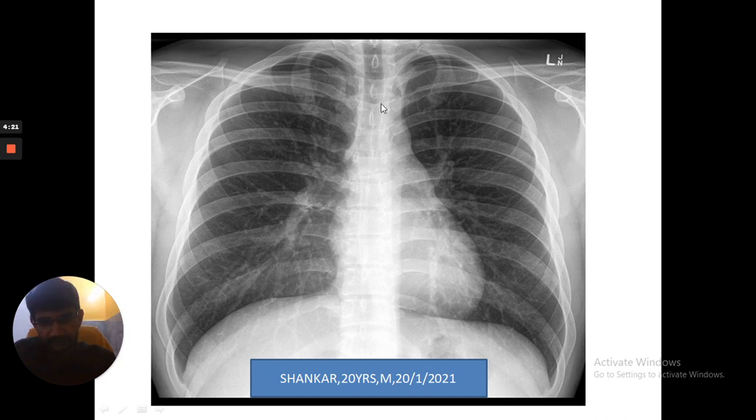This is trachea. Before this you have to check all those things: name, date, time, exposure, tilt, rotation. And then come to this one. This is trachea. And then comes the paratracheal stripe that compares the upper mediastinum. Upper mediastinum and lower mediastinum are separated by the sternal angle.